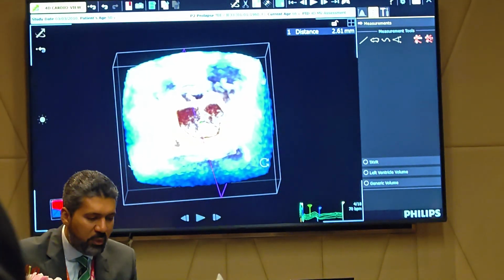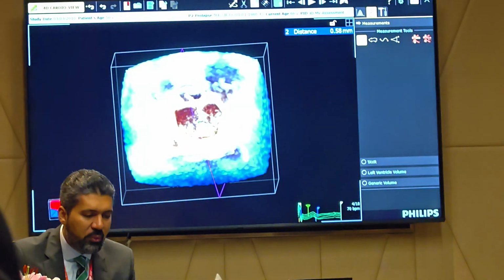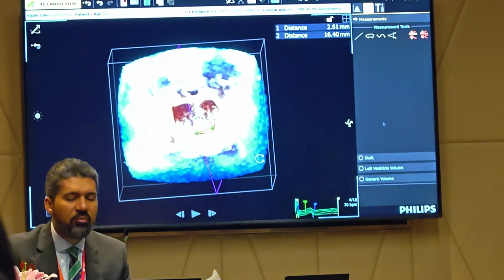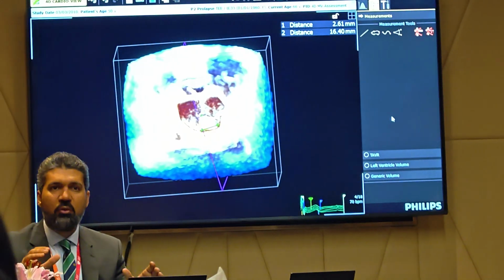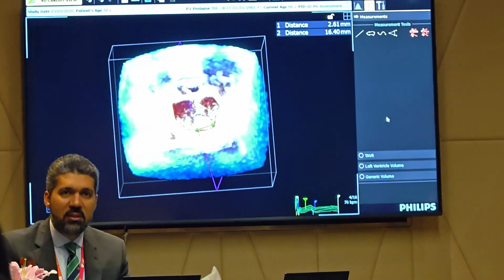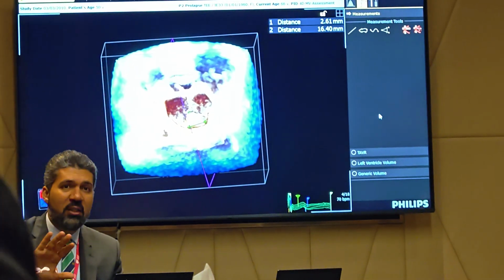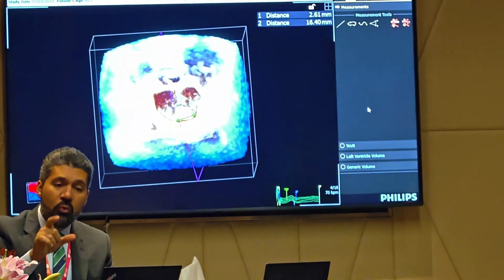This is the flail width from here to here. And on this software, I can do this, from here to here. This is the flail width. On the 3D itself, I can do this. Is it okay to do on 3D? For this one, yes. But I'm against measuring anything in 3D itself. But for this, you can just get the gap.